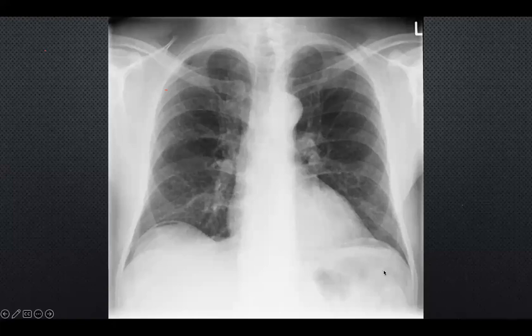With your eye of faith, I don't know if you can see, but over here we've got some darkening. Can you see my pointer? This is a bit darker than this bit, right? And usually we'd say that's okay, that's the stomach bubble, and that's fine. But you should never be able to see that on the right side, because there's no stomach bubble on the right side. So there should never be something darker under the diaphragm. And over here, you've got a nice crisp diaphragm.